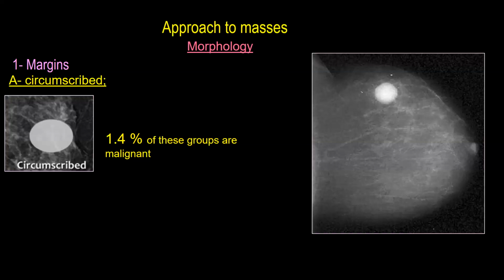Do you remember the differential diagnosis of these malignancies in this group? Do you remember, or shall I mention it for you? Mucinous carcinoma. Excellent.